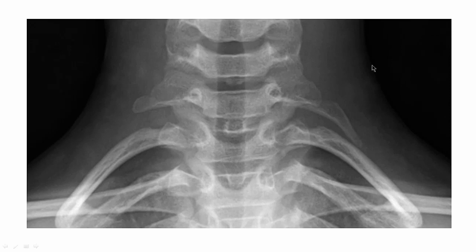Okay, so let's look at this side first. Find me T1. Okay, so here's the eyes, so there's the pedicles. Here's the nice sloped rib. Rib 1 leads right in. Here's the transverse process of T1. So this is T1 right here. Okay, kind of small. This guy's got kind of small vertebrae here.